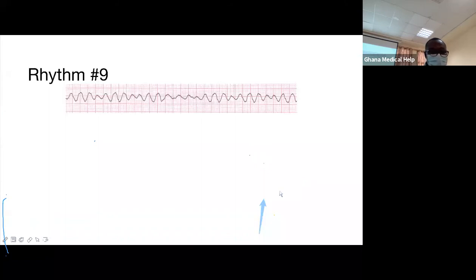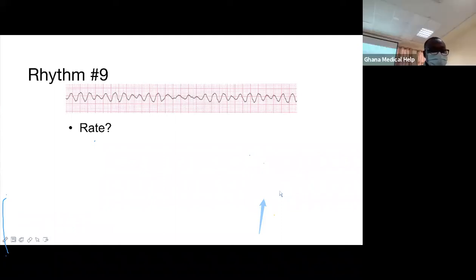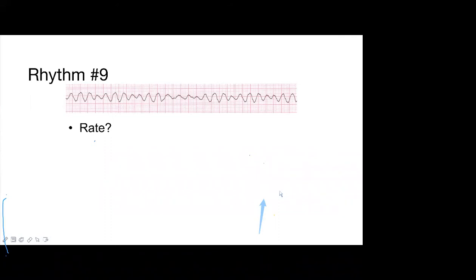Okay, let's look at rhythm number 9. What's the rate here? Sir, does the AV node also fire? Yes, sir, it does fire. Okay. Thank you. So rhythm number 9.